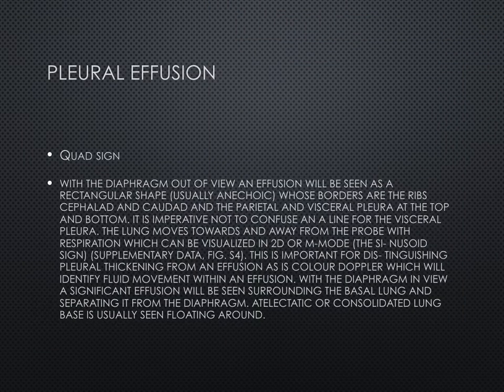So just to give you more of a written definition of what we were discussing there with the quad sign, this gives you some information about how to undertake the measurements we were discussing, using just the normal 2D mode or your M mode caliper type of measurements for finding your quad sign.